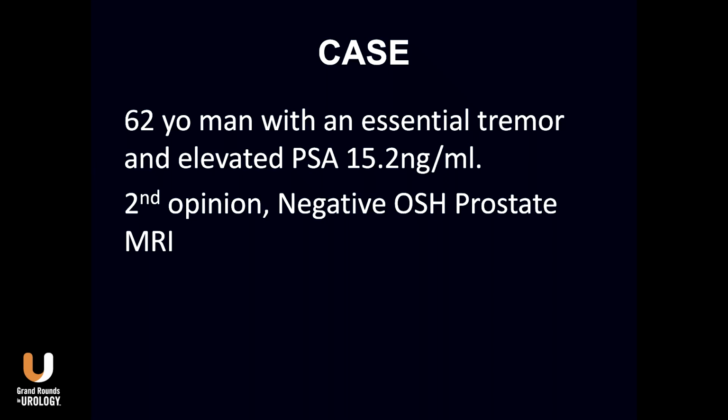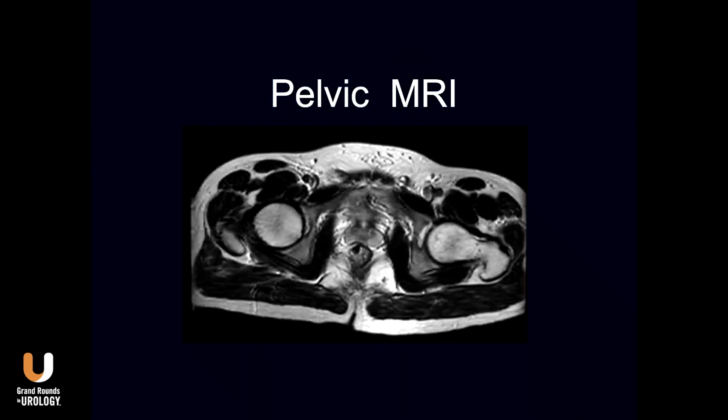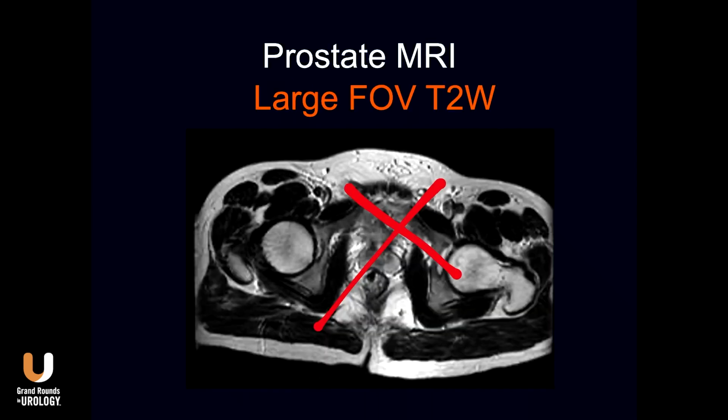A 62-year-old man who came for a second opinion to Cincinnati. And this is his MRI that he brought with him. And right away, this is not prostate MRI. This is still happening, unfortunately.